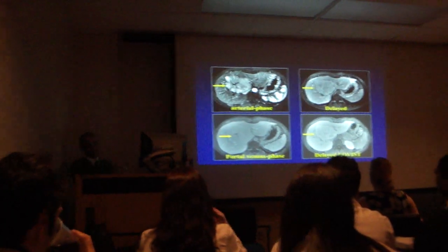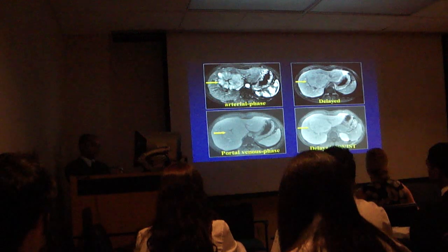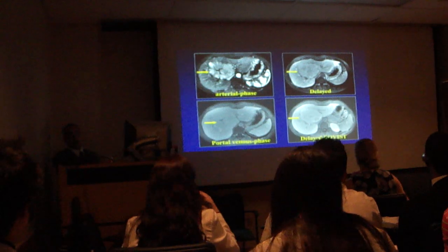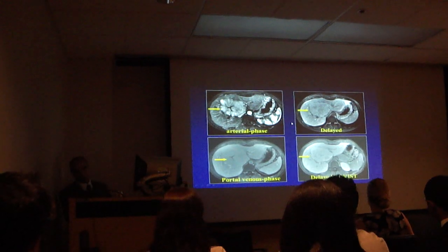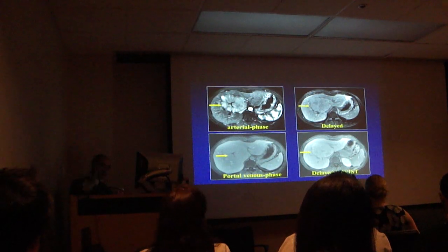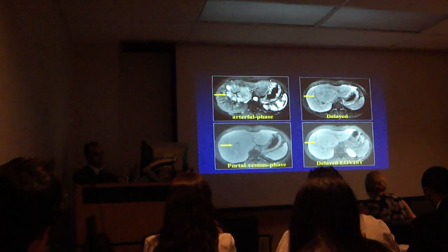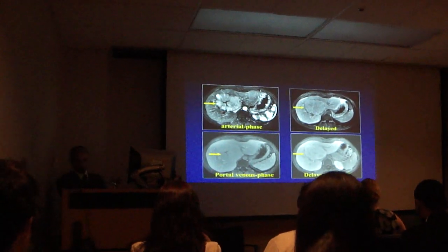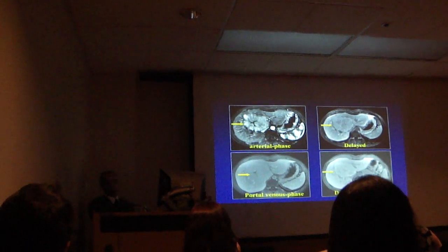So what do we think now the lesion is? Well circumscribed, central scar that enhances on delayed imaging, and the lesion does not demonstrate washout. So is it worrisome or not worrisome? Not worrisome. Exactly. So I'm going to continuously talk about margin and washout, and other features may fall into place and may not fall into place. And remember, not every lesion has read the book. So you can follow the book, but you'll stumble.